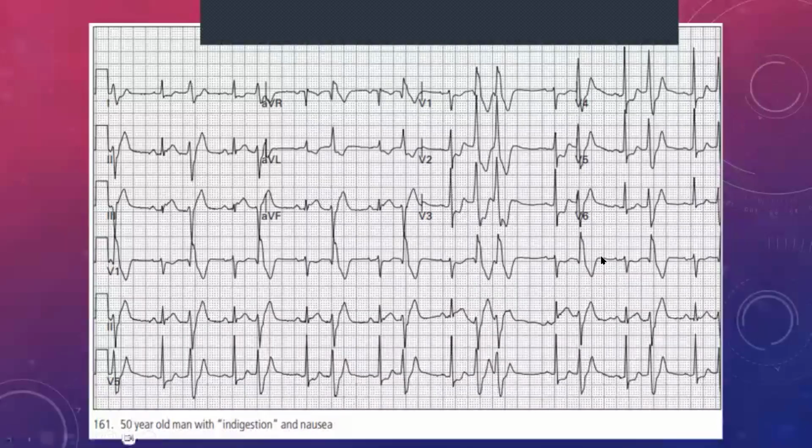Now you put on all your leads, and this comes out and you nearly faint. Now, we're going to discuss this ECG, but I'm going to discuss it in a slightly different way so that you will understand better the point that I'm trying to get at. The point that I'm going to try and put across to you today is that when things look complicated, the best thing to do is to try and break them down into pieces that you can understand. And if you can understand those small pieces, then it's easier to put the whole picture together.